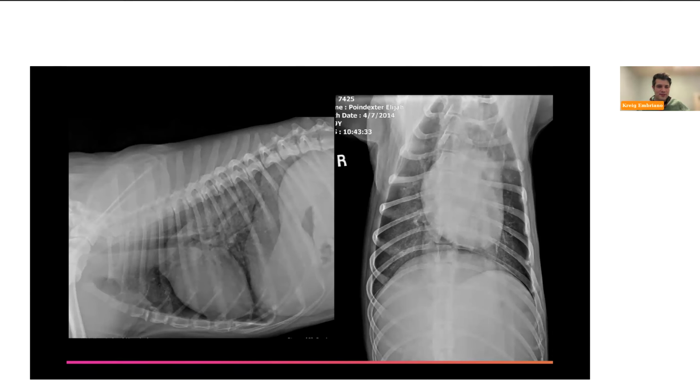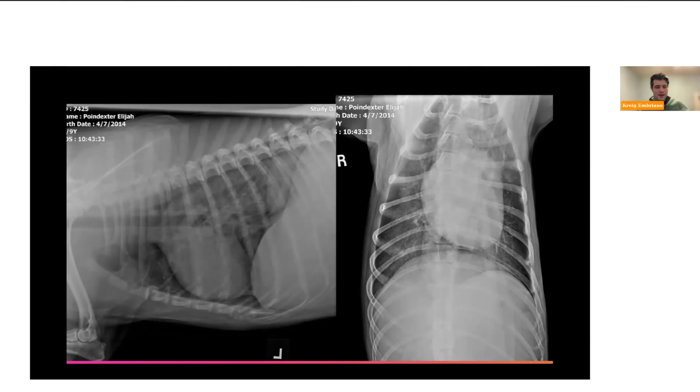And oh, let me go back for just 1 second. There's this convex soft tissue opacity here I don't love. That is in the spot of the sternal lymph node. And on the opposite lateral view, it persists. It's even more conspicuous on this view, despite the thoracic limb being somewhat caudal in position. And we still have that infiltrate, that interstitial pattern.